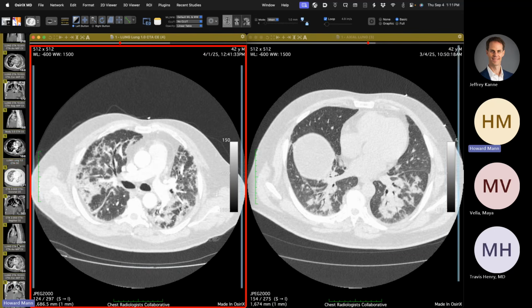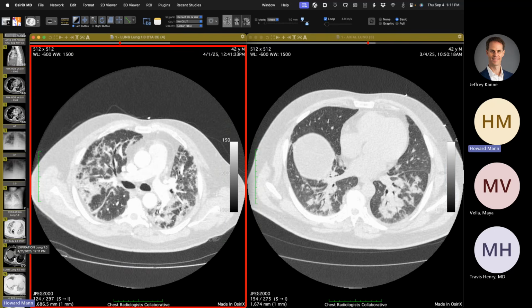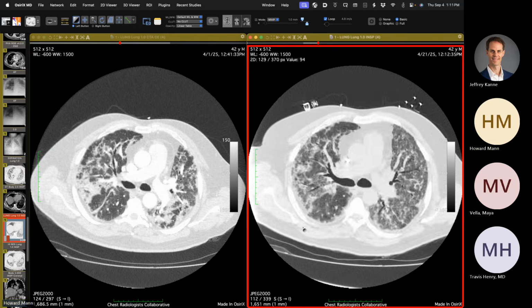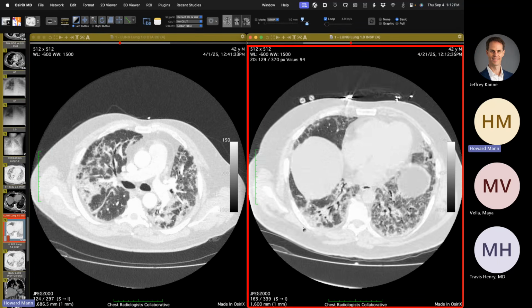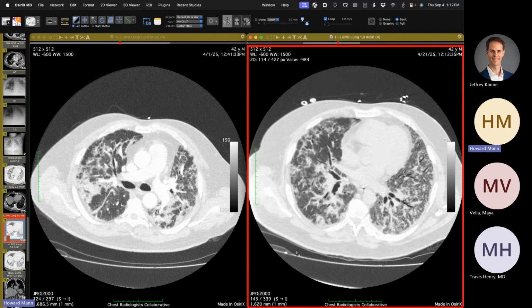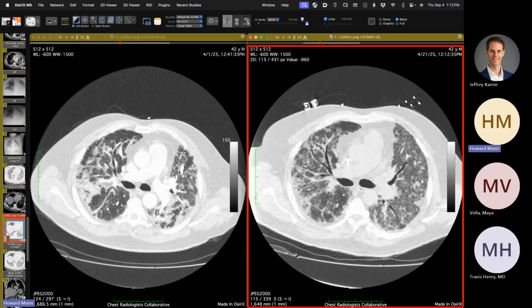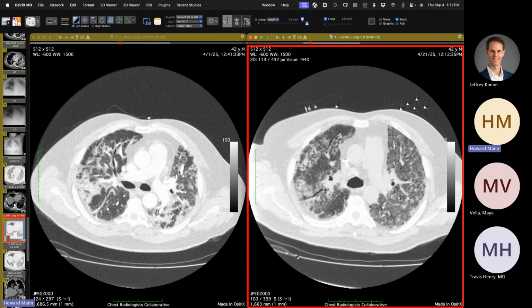And then I'll show you some more history in a moment, but I will show you how this progresses over time to really end-stage lung prior to transplantation. That has this rather unusual appearance. It's obviously progressive diffuse lung disease now. The appearance has changed, but perhaps no surprise that this is progressing, and the patient is then evaluated as a candidate for transplantation, and he underwent transplantation. So relatively rapid progression of the pulmonary disease over a period of months to this appearance.